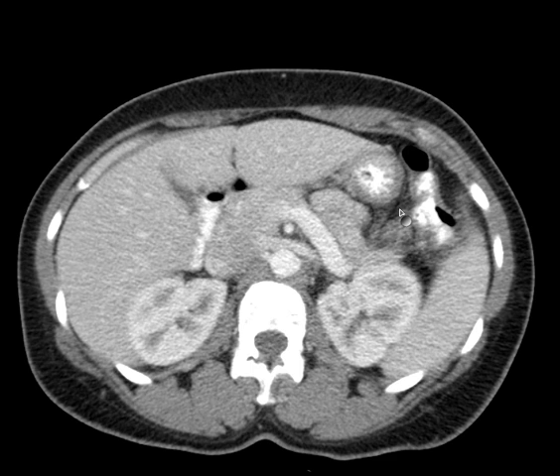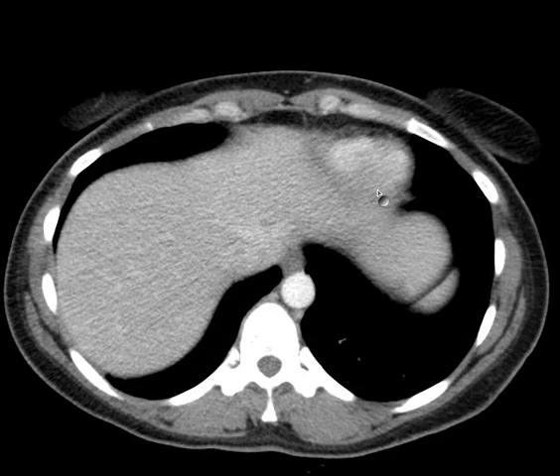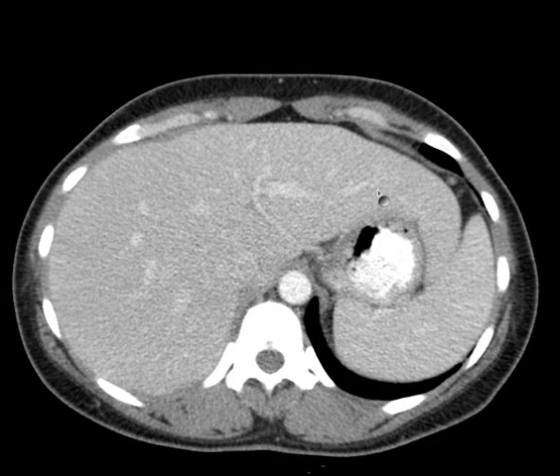So the point that I have made for several years now is that what I would like to see you all be able to do is to look at cross-sectional images, identify an abnormality, and describe what anatomy is involved with that abnormality. Now, it seems kind of simple, but it's really not, and I think it's an important skill set for you as a radiologist assistant.